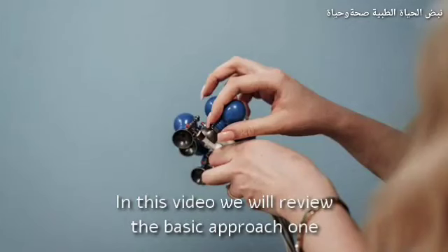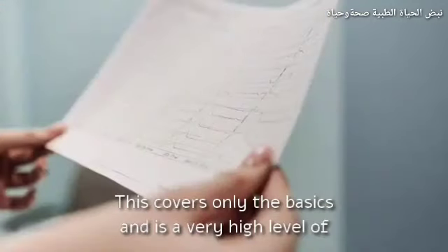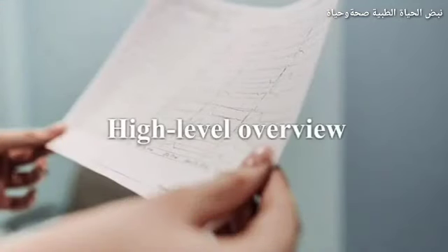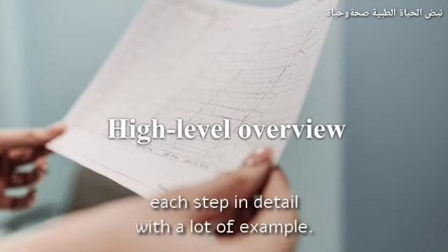In this video, we will review the basic approach one should consider when interpreting an ECG. This covers only the basics and is a very high-level overview of the process with very little detail. We are currently developing a course which covers each step in detail with a lot of example ECGs as we go.